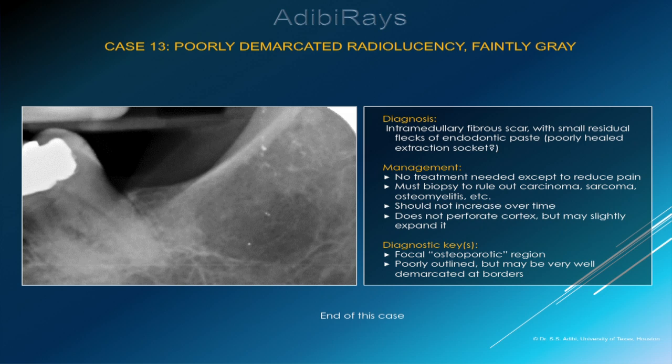Key diagnostic features in this case are focal osteoporotic regions and a poor outline with demarcated borders.